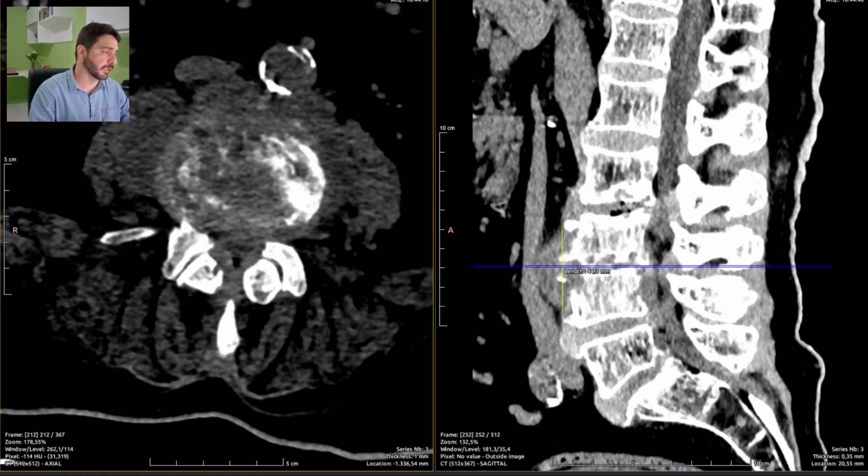So I can see there is an apparent soft tissue lesion. Because there is no contrast injection, and even if there was contrast enhancement, it's quite difficult to be certain about soft tissue lesions on a computed tomography scan. So it's way better to have an MRI. I'm going to suggest an MRI at the end, as a footnote of this report.